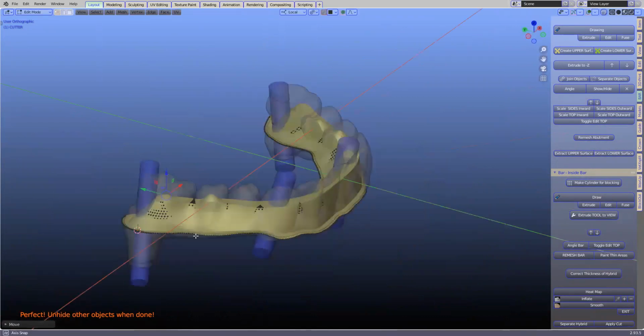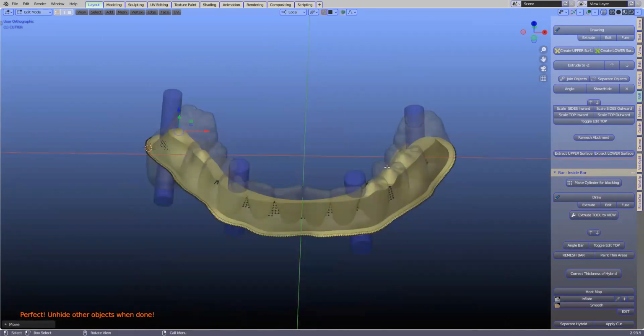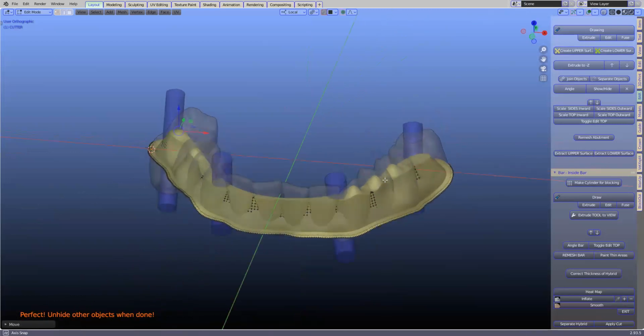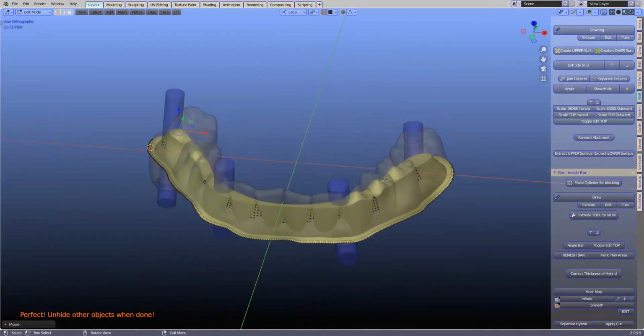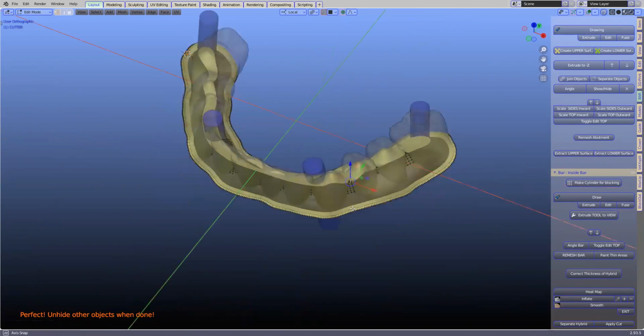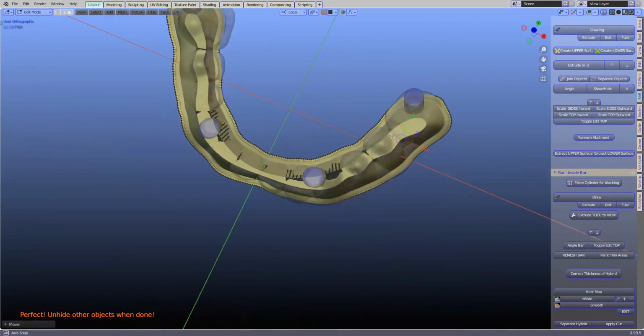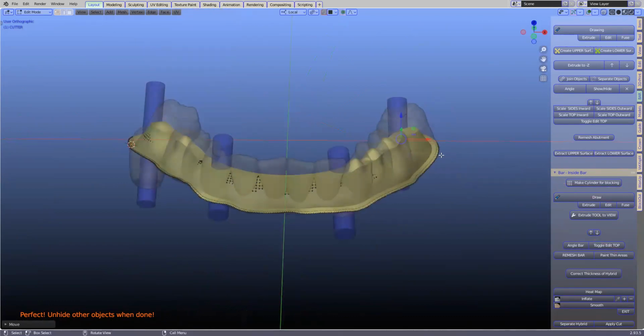Yeah, so you've got like little things like that. I don't know how relevant that is, whether that's even needed, but you can imagine for retention, especially if you've got a very flat surface or something, and the bar itself doesn't go up all the way. So it does have merit, I think. Wolfgang, what do you think? I don't know. In the back of my mind, I'm just thinking now the thickness of the denture, because we've had so little space, which makes the heat map a very good tool to have in this menu. Can you show us when you're finished?